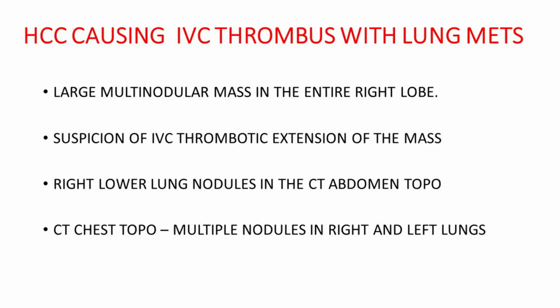But remember that the hypoechoic pattern in the IVC might be seen in most of the patients in the arterial and portal venous phases, especially the early portal venous phase. Don't judge them as thrombosis in the retrohepatic IVC. The retrohepatic IVC will show full enhancement in late venous phase or in the equilibrium phase with no evidence to suggest any thrombosis.